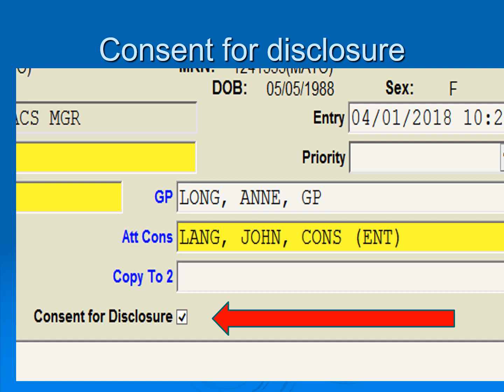If this box is unchecked, event reports are generated recording all access to the patient's records, both RIS and PACS. You may need to uncheck this box for specific patients, for example, staff members, children under protection orders, public figures, and so on.